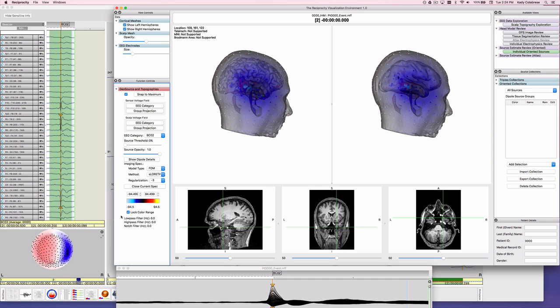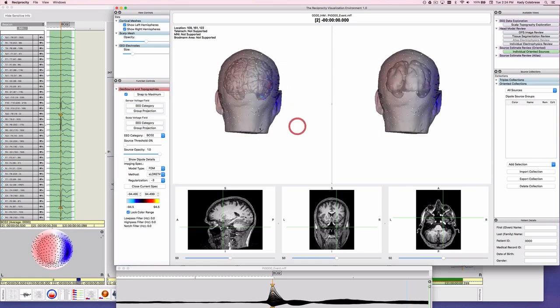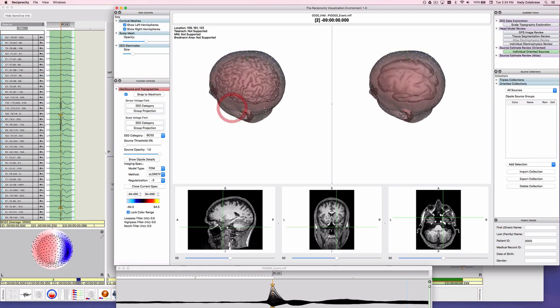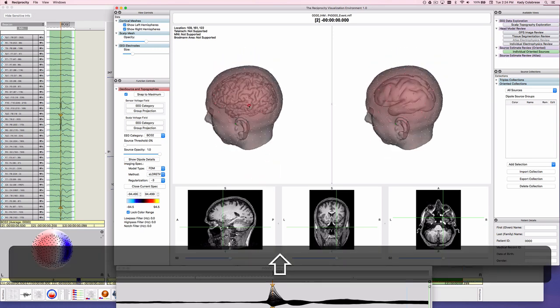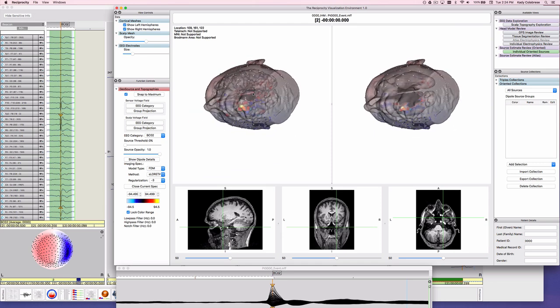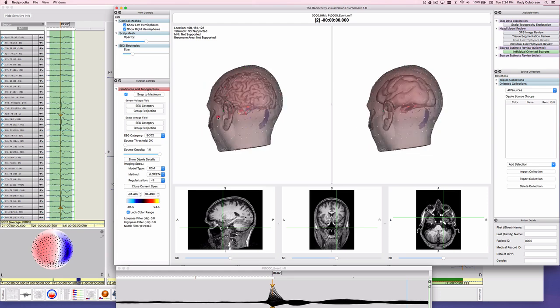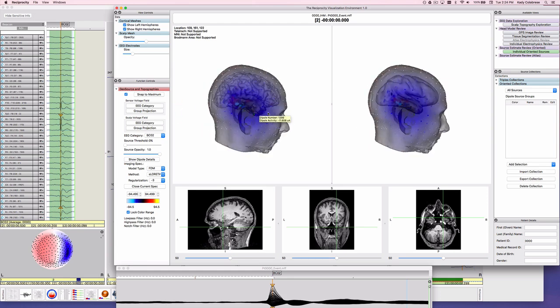Assess results. Values in source estimation represent the relative strength of a dipole required to reconstruct the scalp topography in question. The different dipoles can be visually identified by patches of color. The individual head model describes the subject's own cortical surface, which means each dipole has a fixed orientation in relation to the cortical surface. For every given dipole, the source results give you a single value that represents 2 things: the current being generated at that position and its contribution to the potential field measured on the scalp.